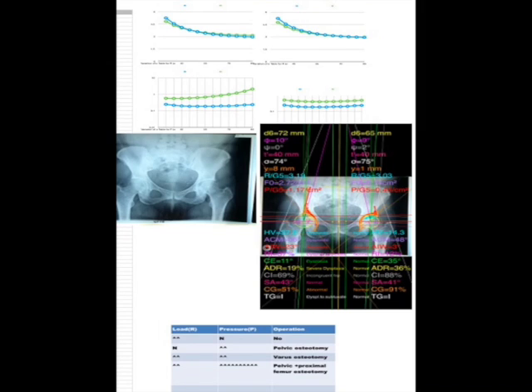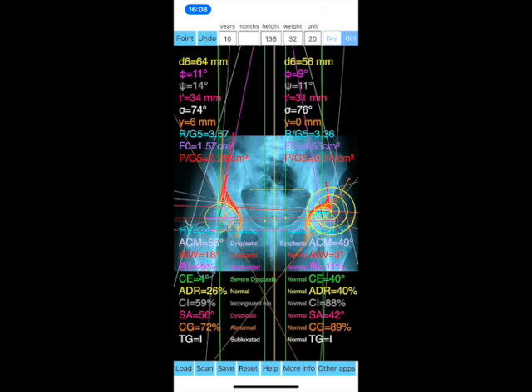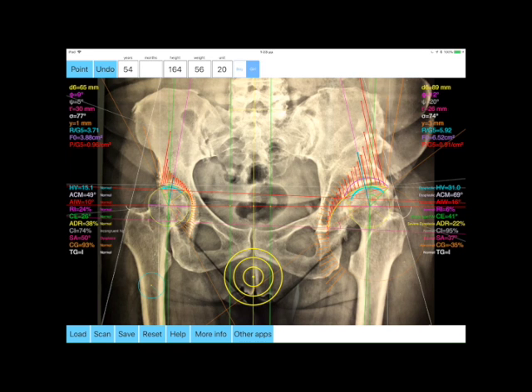Data from load and pressure distribution in the hip, like in real biomechanical tests, are being measured and depicted graphically as vectors over the X-ray and the screen over the joint. The distribution also of compressive stresses over the acetabulum, which is usually associated with radiographic sclerosis over the acetabular margin, are printed in real time over the screen and thus can be easily and objectively evaluated.